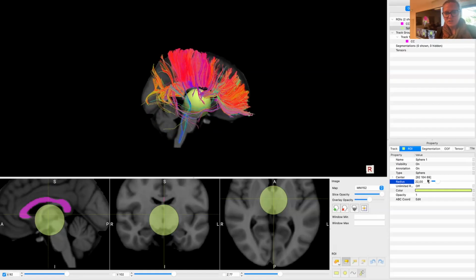So what you can try is you can try and make it bigger, but at some point we will be constrained by our region of interest, okay? So don't make them overlap. Then we need to add like another. Then you would need to add another, yeah. Or you start off by, you just add another.